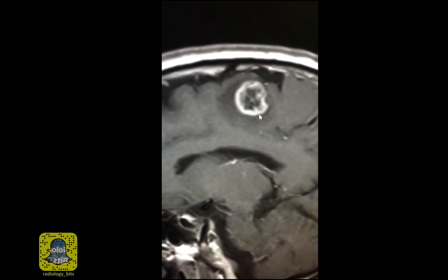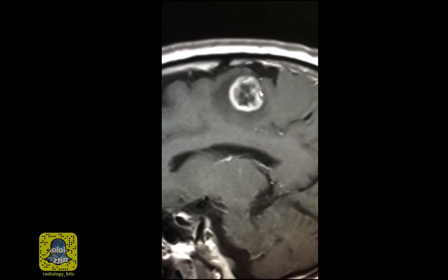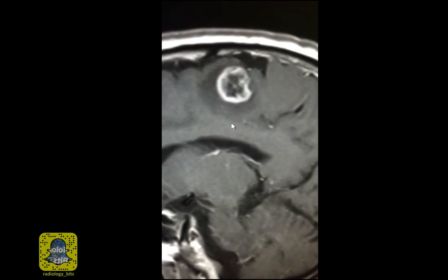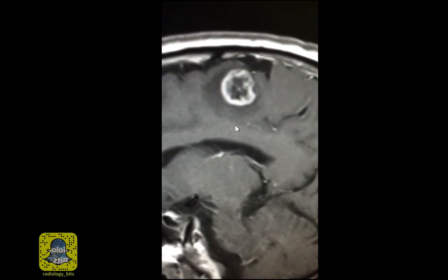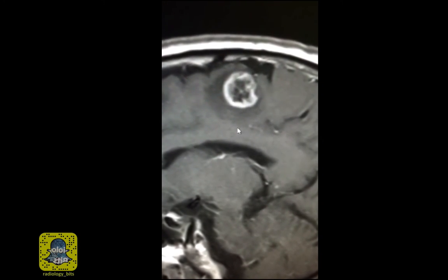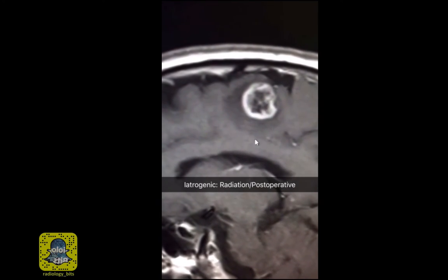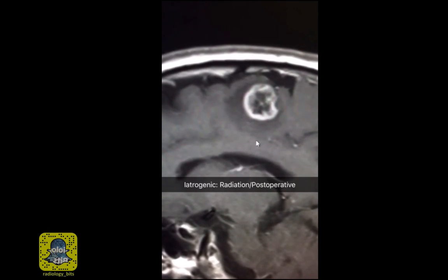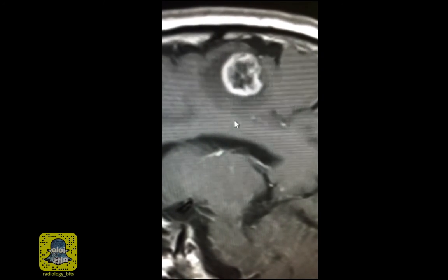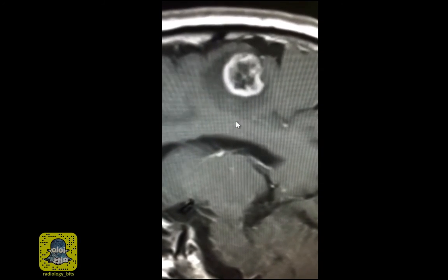With demyelinating enhancement, the rim is usually incomplete and the incomplete opened border is usually towards the cortex. With demyelination, you'd expect to see multiple abnormalities. However, tumefactive MS may occur as a unifocal lesion. The fourth category includes that of iatrogenic causes, such as after radiotherapy or surgical treatment. Radiotherapy itself could have an enhancing lesion, and a post-surgical cavity may show an enhancing rim.